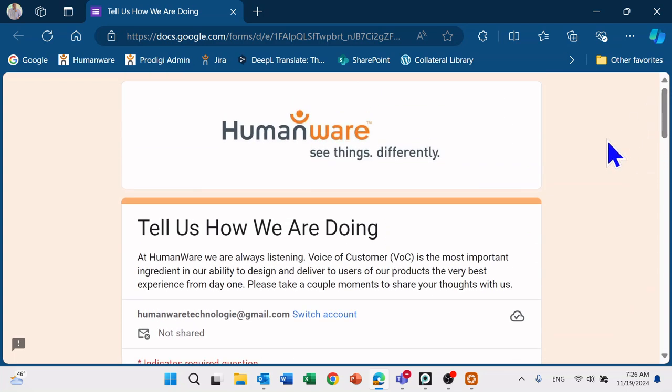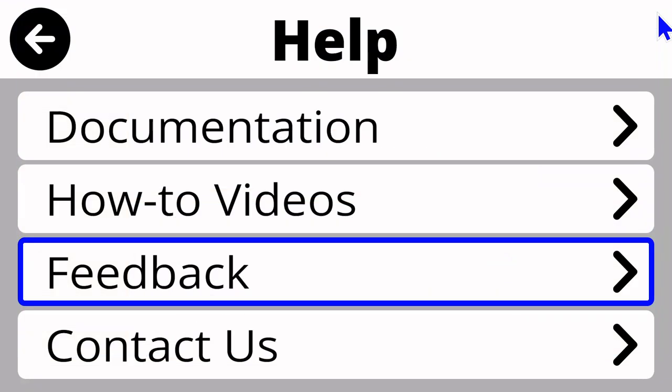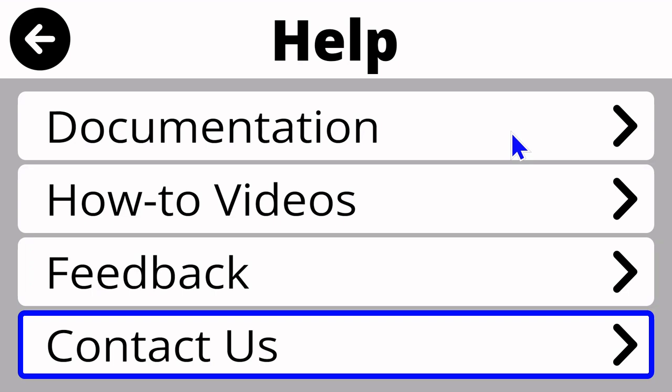When you feel so inclined, we could very much use that information to help us continue to improve Prodigy for Windows, as well as all of our other offerings here at HumanWare. Let's click that X in the upper right corner of this browser window again. We will tap that down key on my keyboard one more time, and I'll hit enter.